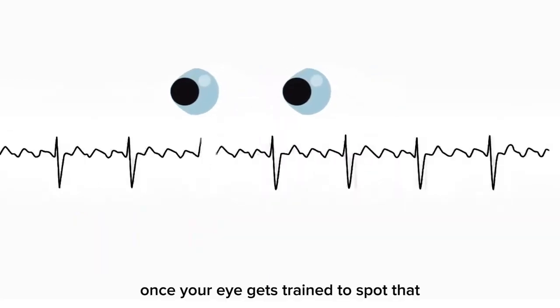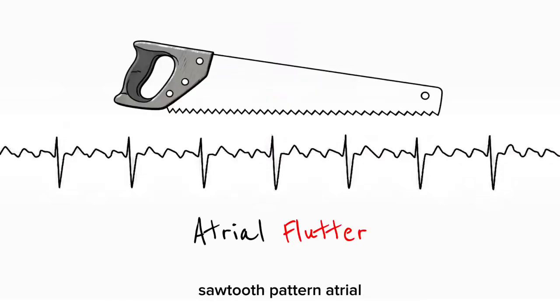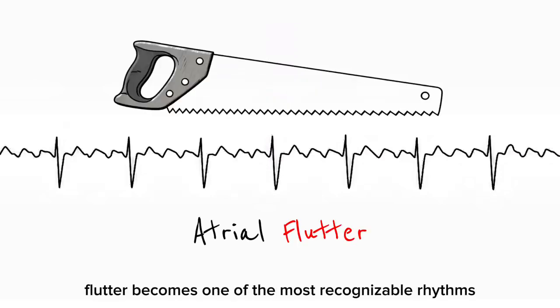Once your eye gets trained to spot that sawtooth pattern, atrial flutter becomes one of the most recognizable rhythms in cardiology.